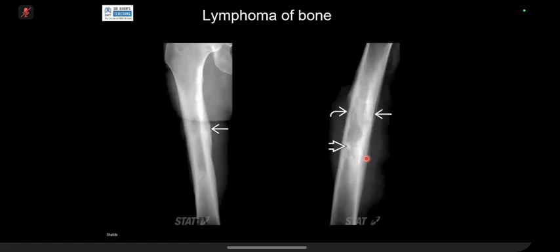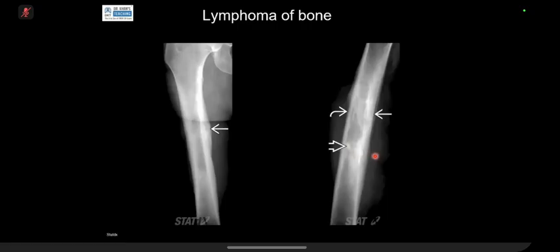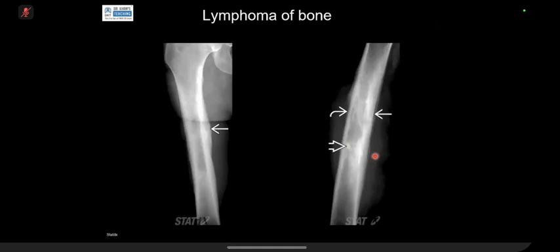It could be, no, it's not calcification. Sorry, I don't know. So, yeah. You are close to it. How will you call it? Because I'm going to give you a mark for this. I will call it a dense lesion. Suppose I tell you that this is a case of osteomyelitis. What do you call it?